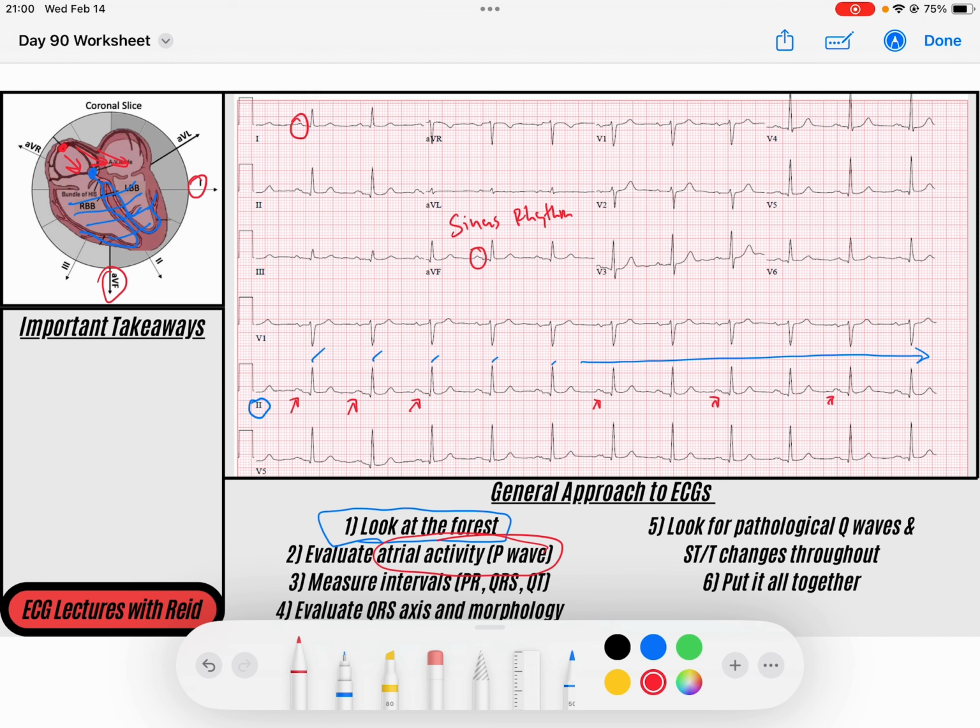And when you have a regular rhythm like this, sinus node behavior is usually pretty predictable, right? And so if we look at the rate of these sinus beats, if I find a QRS on a solid line, of 300, 150, 100, 75, 60, so maybe anywhere between 60 and 75. I'll call this 70 beats per minute, which is appropriate for the sinus node.